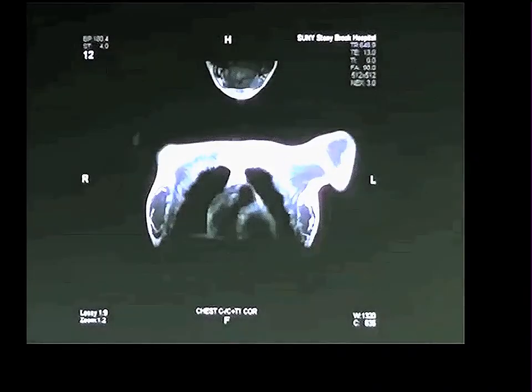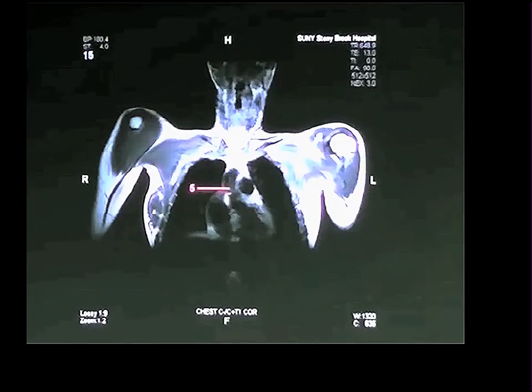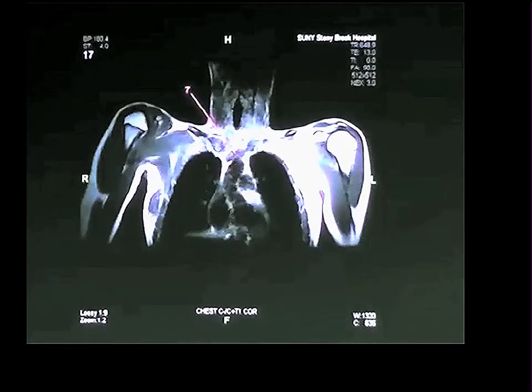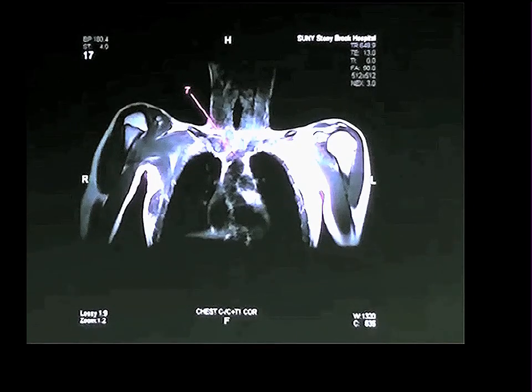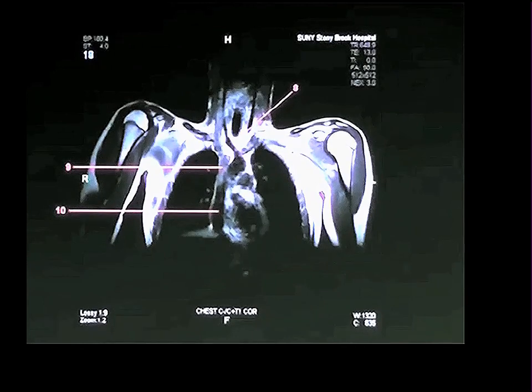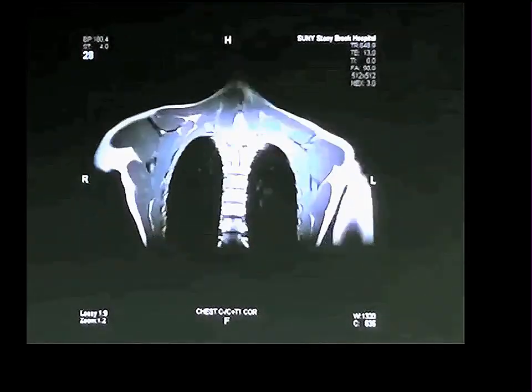And if we go back, here we are towards the front again. We take a look at our left ventricle right here. It's going to give rise to an aorta. There it does. Here's the aortic valve. There's the ascending aorta. The aorta is going to come and swing up as the arch. And the arch is going to give off a brachiocephalic artery. But of course, crossing in front of the brachiocephalic artery is the left innominate vein, or left brachiocephalic vein. So that's number 7. And then when that disappears, we see the brachiocephalic artery. You see the superior vena cava and right atrium. You go through these on the right. It's just a knowledge of anatomy, nothing more to it than that.